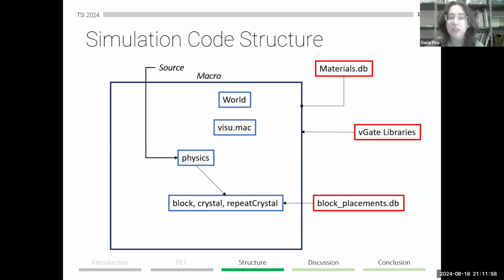The source location includes details. The source code is going to also contain details about the forced unstable flag, which we set to true. And then we use a spherical volume type, with the activity set to 10^5 Bq. A back-to-back gamma simulation with 511 keV is simulated, and then the half-life is going to be manually set to 6,586.2 seconds, which corresponds to the half-life of the radioisotope 18F.